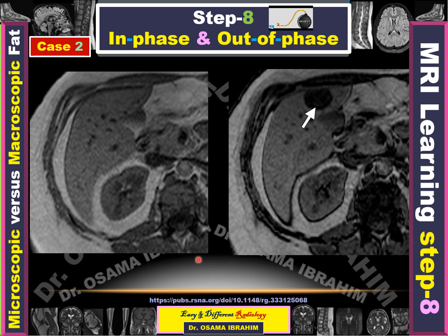Also, I give you 10 seconds. Where is the opposed phase? This one or this one? Or are there no opposed phase, no out of phase images? Actually, this one is the out of phase because there is an outline for the liver, the right kidney, and the muscle. If you look at the other image, this black line does not appear. The boundary artifact, chemical shift artifact, and India ink artifact are all names for the opposed phase or out of phase. So there is an opposed phase.